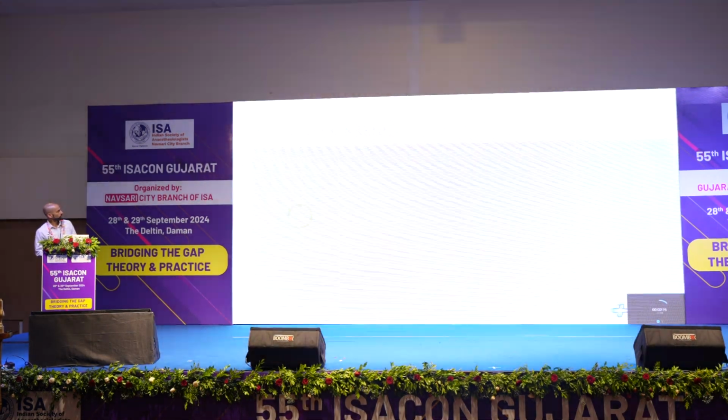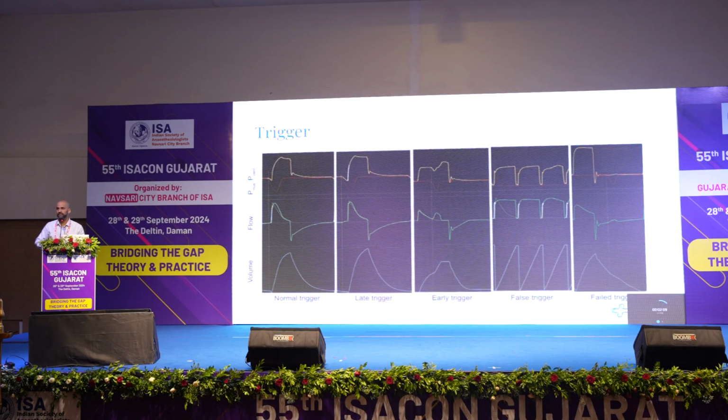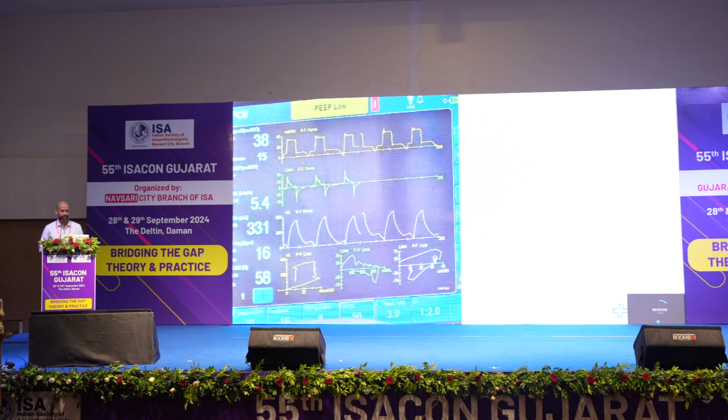So now we'll go and look at other abnormalities. Yeah. So we finished resistance, compliance and patient effort related loads. This is to look at trigger patterns. There are 4 trigger patterns: late, early, false and fail.